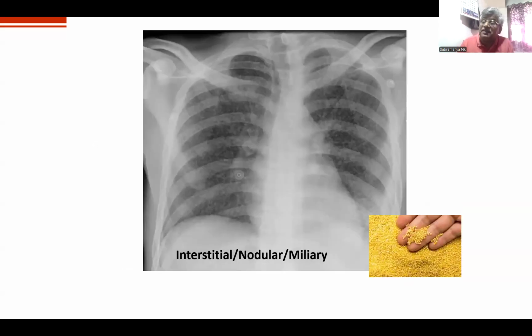This is miliary, and miliary is interstitial. All of you will say miliary tuberculosis. No. Don't say miliary tuberculosis. From now onwards, you say interstitial miliary shadows. Differential diagnosis, one of them is TB. Why is miliary seen well? The dots are seen well because of air contrast surrounding the miliary nodules. Please type L if you like this. This is aerogram around the milia that makes the milia be seen as distinct, starry, punctate-like things. You understand? That is different from pneumonia. Please understand, this is different from alveolar shadows, okay?